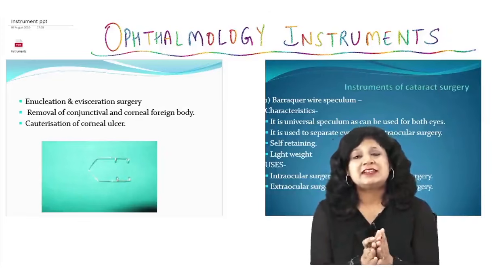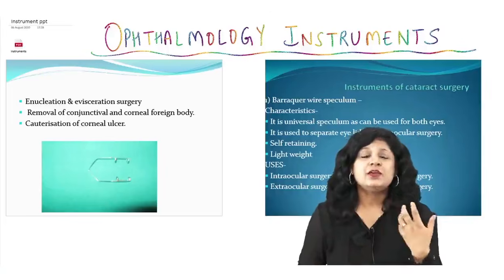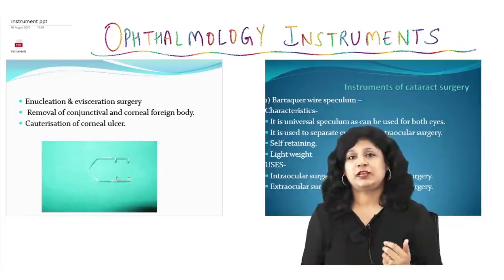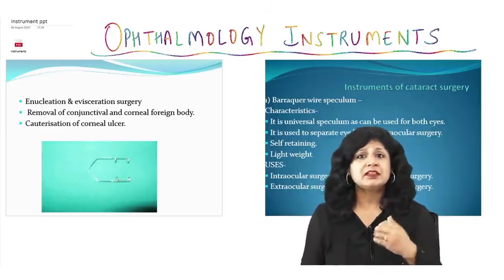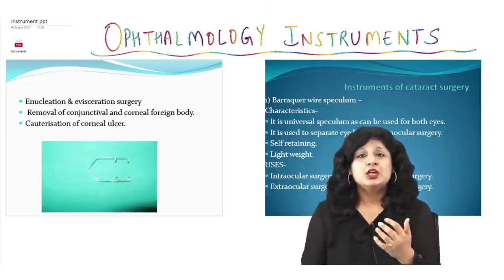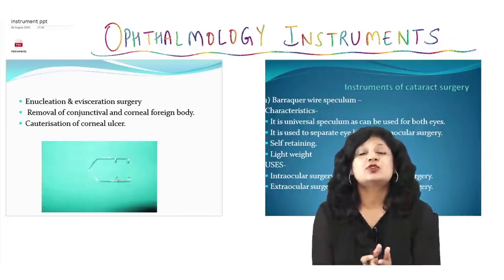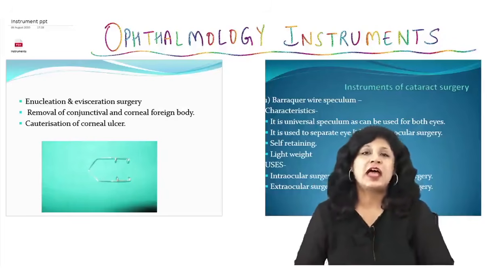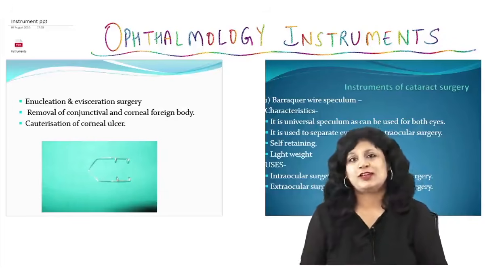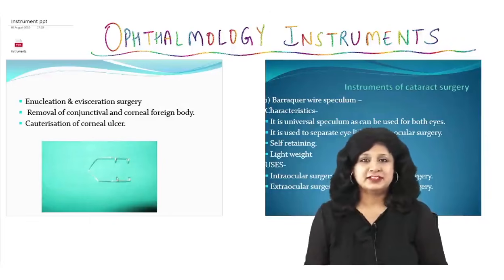But the second reason why I want to discuss the instruments is that while you are going through the theory of ophthalmology, there are so many procedures that you study, so many steps that you are studying. So it becomes slightly cumbersome to understand those surgeries or those steps unless you have sound knowledge of the instruments. So let's begin with the first one.